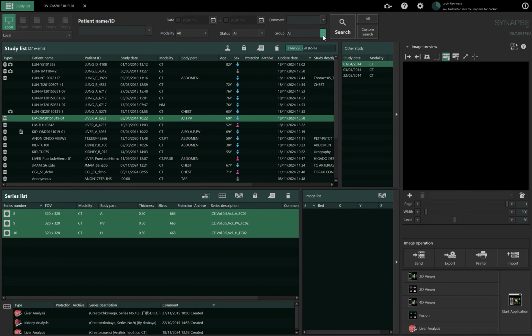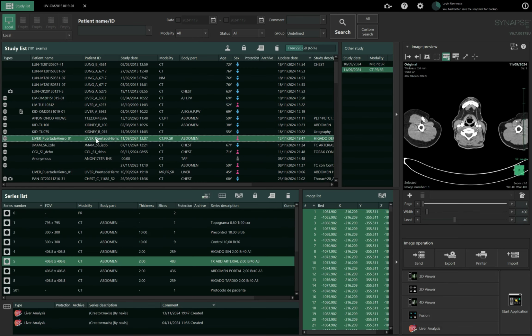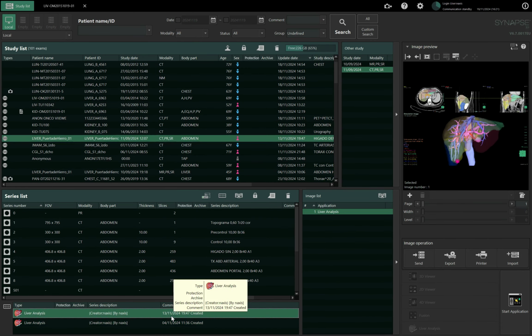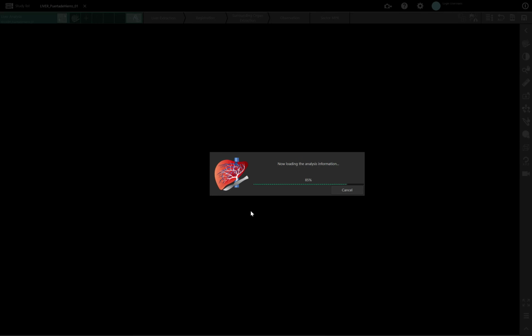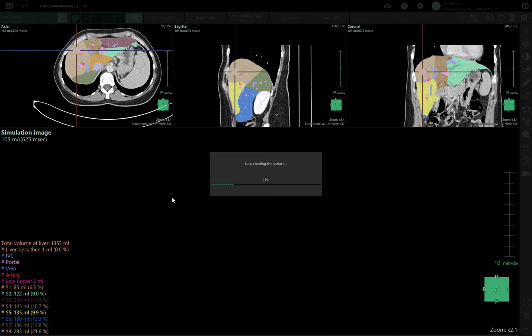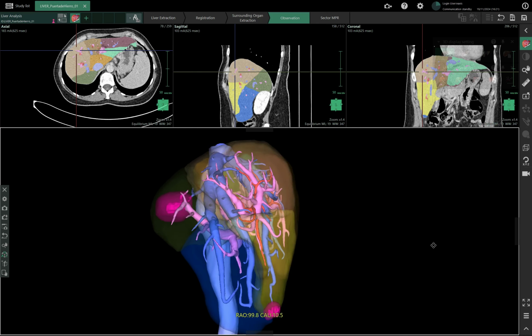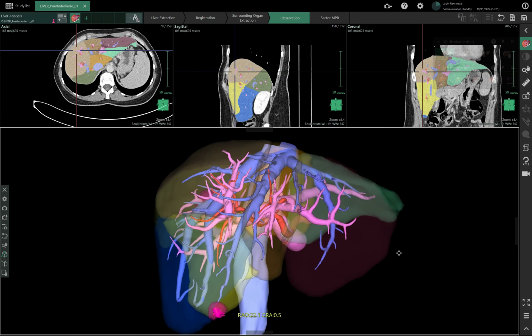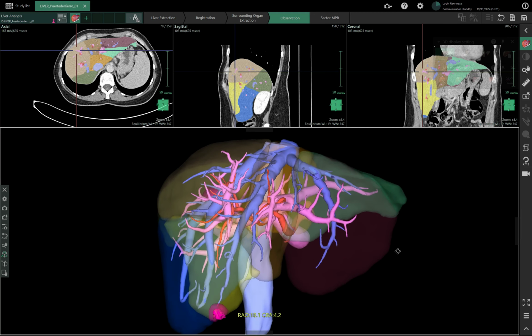I will show you this here, so yes, this is the case. This is the patient they gave me, and this is the result. At the end of the day, I think it was not a really complex or difficult case. But they were not afraid that this extraction would not be accurate, because the extraction is done automatically.